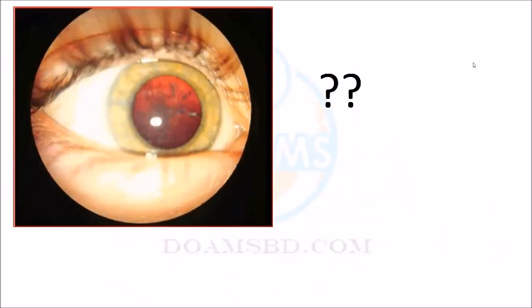Very simply, who can say the diagnosis? If anybody has gone through this class, it's a straightforward answer. Cataract. Yes, the haziness in the red reflex, right? The red in the red reflex. This is normal. This is cataract. Very good answer.